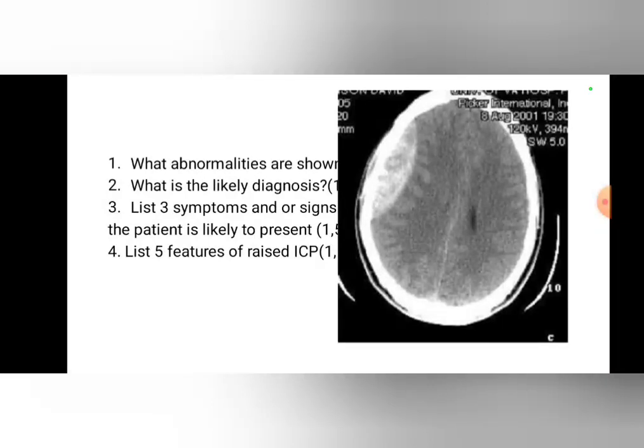That's a ventricle, the left ventricle. But if the left ventricle is not clearly seen, it means that you are still up at the level of the CT scan. So it's the frontoparietal aspect. Frontal because it's moving from in front and then going behind to the parietal aspect of the head. So your abnormality here is a crescent shaped hyperdensity located in the frontoparietal aspect of the head.